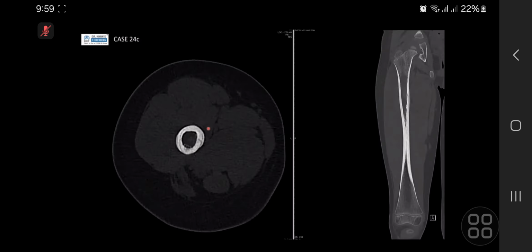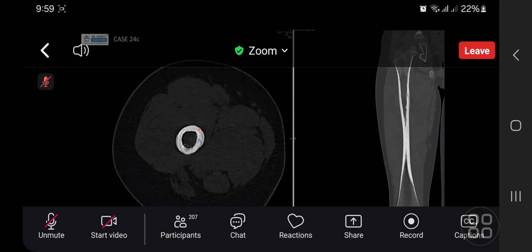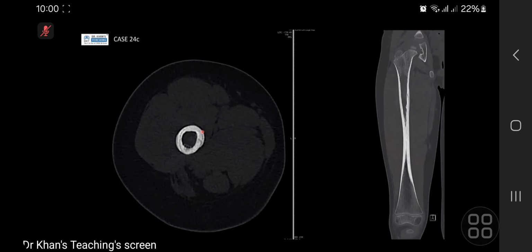And then on the CT, the same cortical thickening, and you've got this little area of lucency here. I see where you're coming from. You're thinking it's a tract, but if it was osteomyelitis, then you'd be expecting a bit more sclerosis, and certainly some soft tissue changes, which we're not really seeing that florid on the MR. I did say it was periosteal location, but often it starts in the metaphyses, then goes subperiosteal.